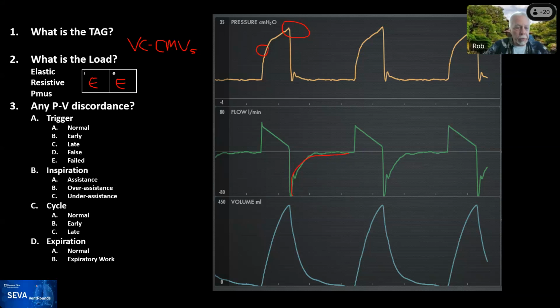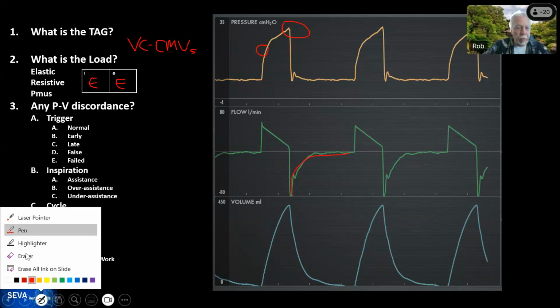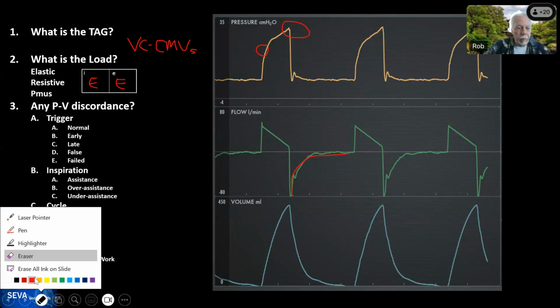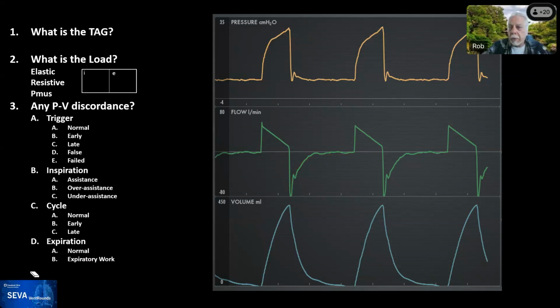Now, do we see any evidence of PMUS anywhere? What do you guys think? No PMUS? Very good.